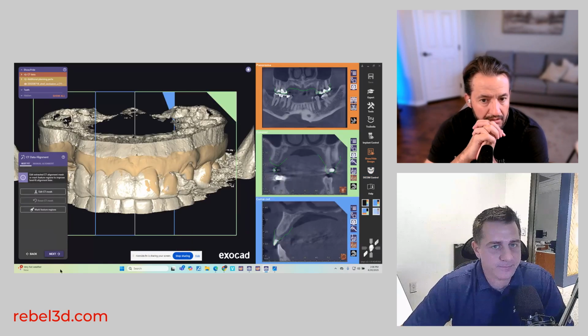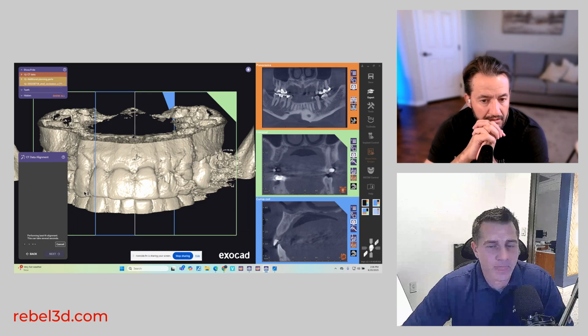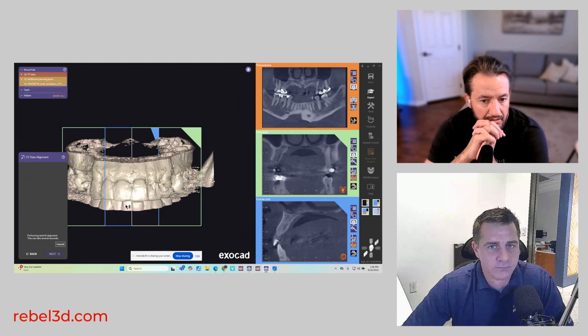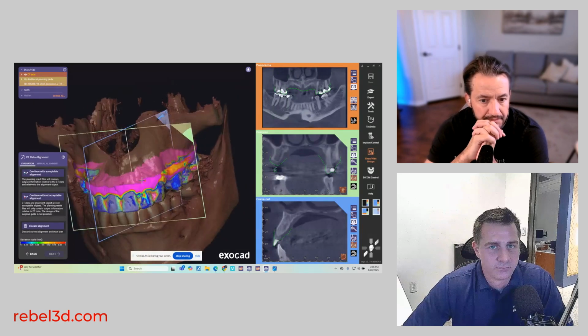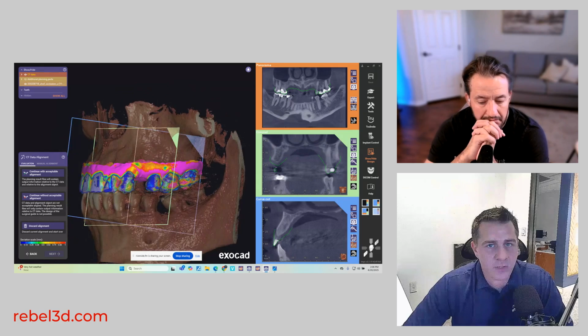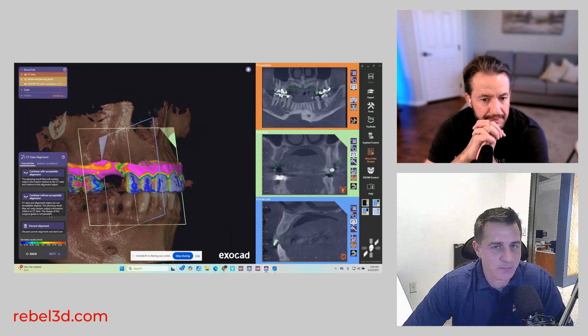Try it that way. It came out pretty much the same. We've got blues in here, so I think that's a pretty good match.